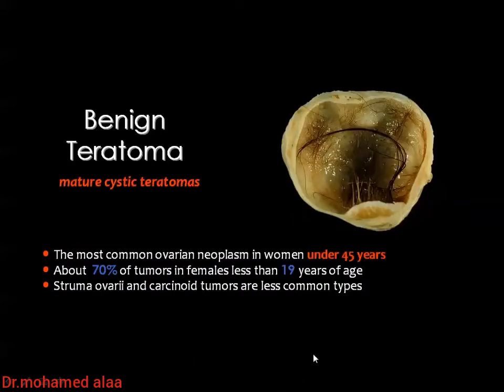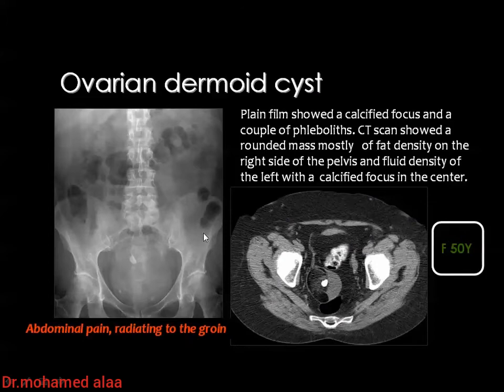Teratoma, you know, is a benign lesion, also called the ovarian dermoid cyst, and the diagnosis is based on the detection of fat inside the lesion. And this is one of the values of the plain X-ray, and you can see some tooth-like calcification in the pelvis. Then you can diagnose this as an ovarian dermoid, of course, if this is a plain film of a female patient. And this is used many times in the exams, as you know.